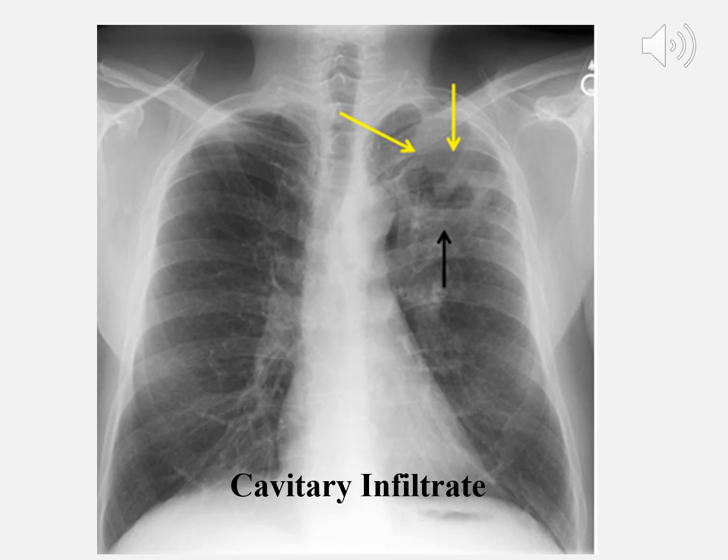Another cavitary infiltrate. Again, you can see that as a cavity. It appears to be cystic appearing. Generally have thick walls. If you see the large black arrow at the bottom pointing to the bottom lower wall, you can follow that wall around, see how thick it is, but it looks like a cavity that contains something. Again, generally metastatic, but can be from other sources.